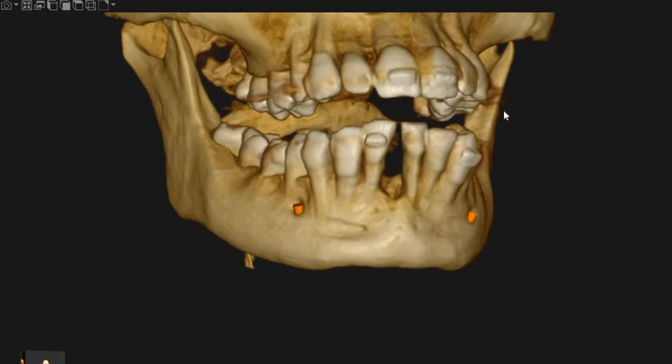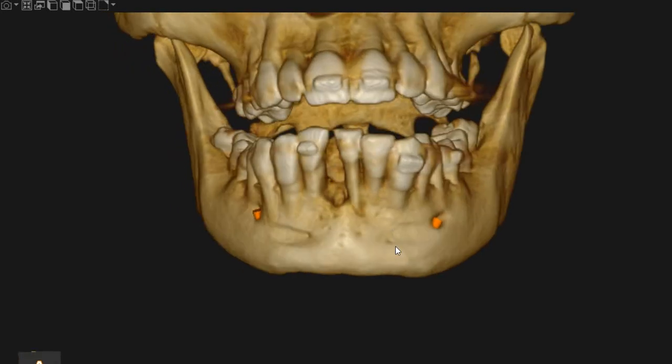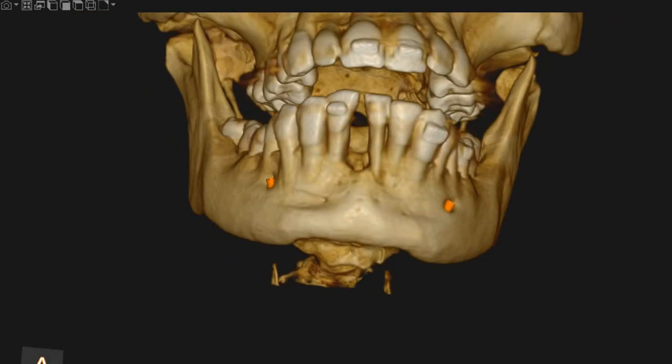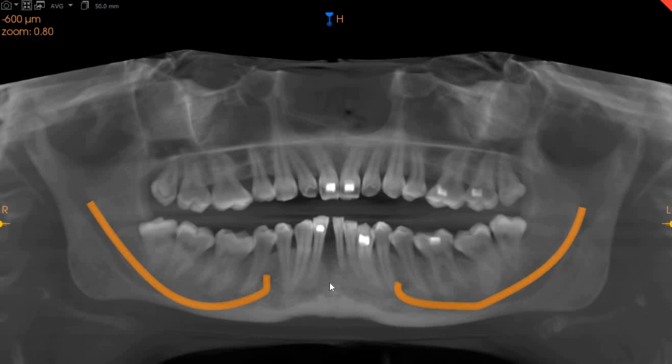We can see buttons, and we're presuming this patient is going through significant aligner treatment, and that is visible on the 3D rendering. On the panoramic view, you can see this is where the tooth was extracted, and there is significant bone loss between the central incisor and the lateral incisor on the right hand side. My apologies for mentioning the central initially. We had not seen that there was an extraction. We can also see that there is a lot of tipping instead of bodily movement of the teeth as a result of this aligner treatment.